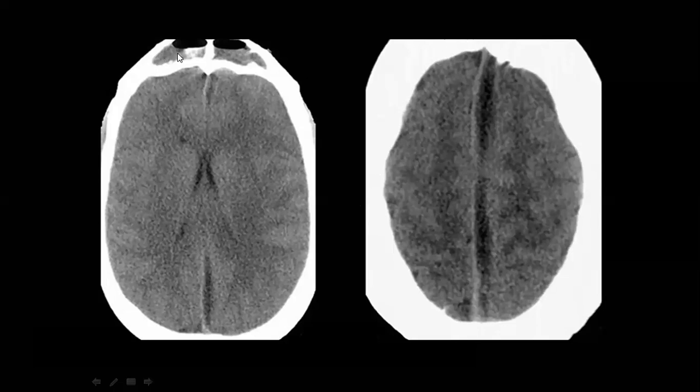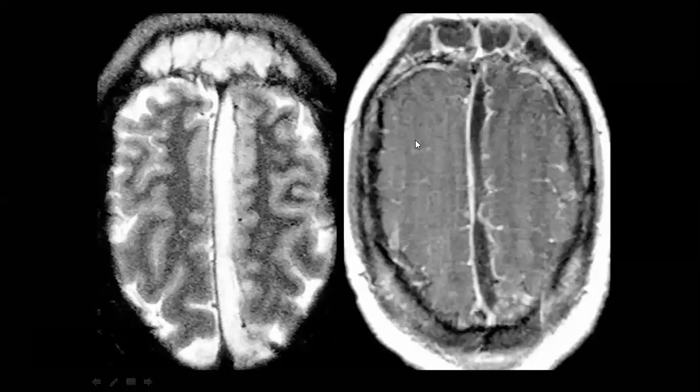But before you rush into any diagnosis, don't forget to look at this. This is the clue for this case, that you will think this patient has sinusitis. When he has sinusitis and the infection spreads, it will remind you of our case from a while ago, especially if this patient has something in the skin that goes inside.